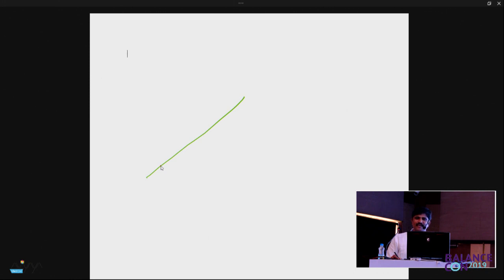If it is staying where it is, how does the line look like? Horizontal line. Fine. So this x-axis is the axis that tells us the timing. Is that right? So if at this particular point of time, what is happening?